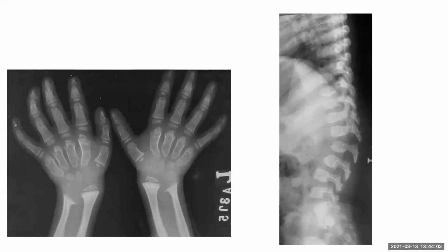Okay, so this is a lateral X-ray of the dorsolumbar spine. I can see there is posterior scalloping of the lumbar vertebrae. Also, there is anterior peaking, inferior anterior peaking, of the lumbar spine.